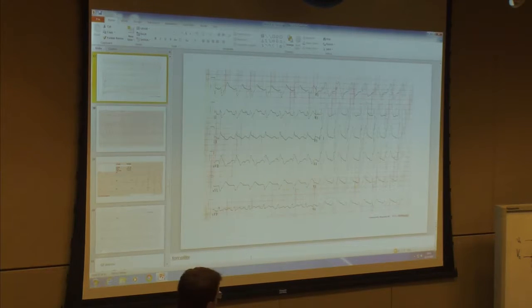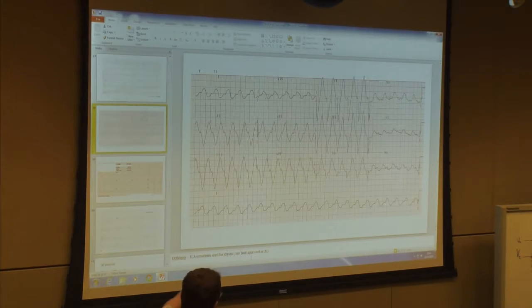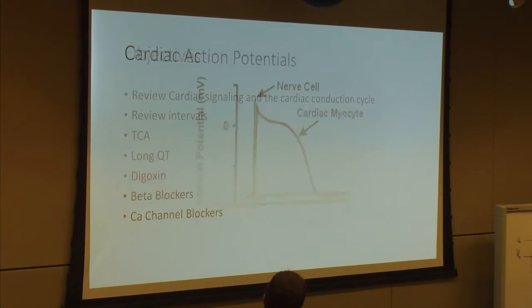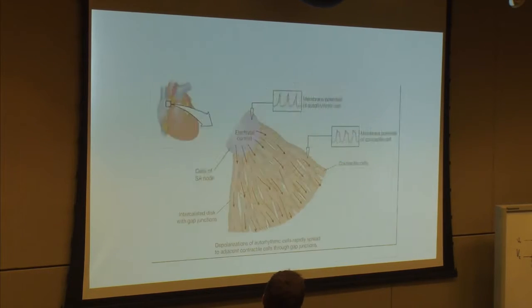So bizarre wide. Here's another tricyclic. It's not used in the United States. It's mostly used in Europe, but it's a good example of bizarre wide. I look at it and say, what the hell is that? Is that VTAC? Well, what's the rate of this?